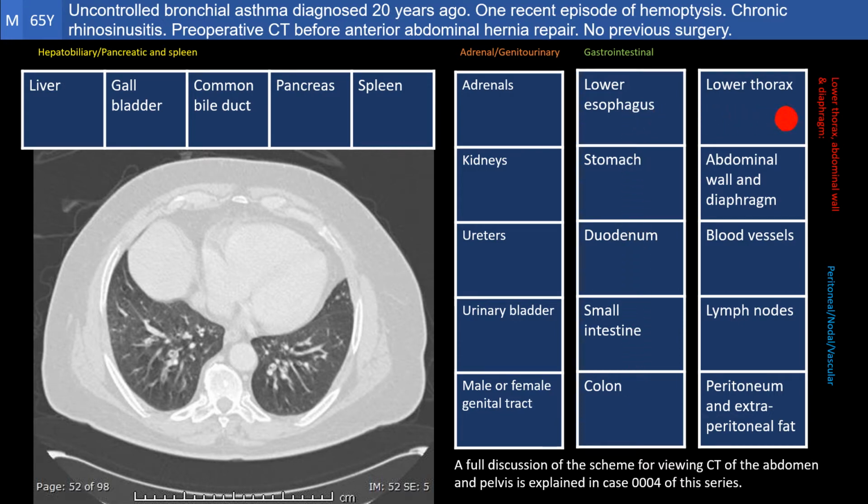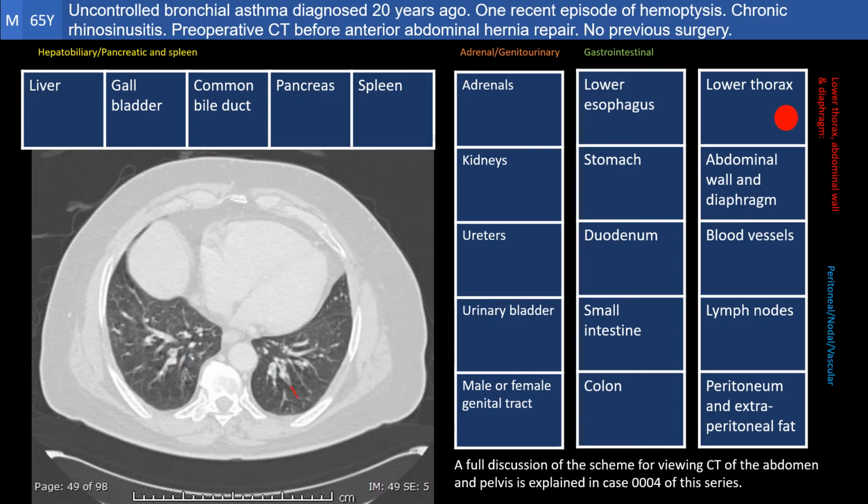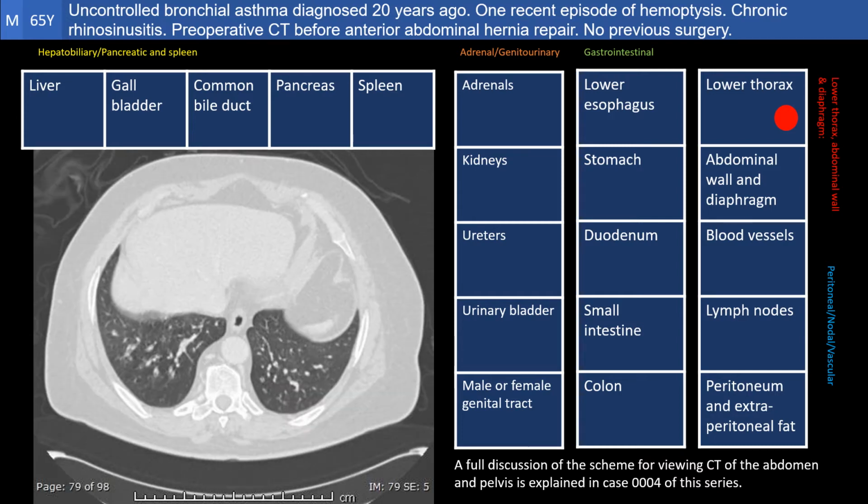Going to our third station, the lower part of the thorax, we notice here that the bronchi have very thick walls, and some of them are quite clogged with secretions. So they look exactly like the adjacent blood vessels, up to the formation of a frank bronchocele.